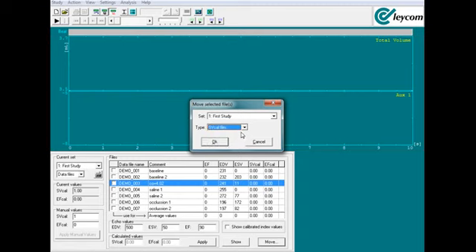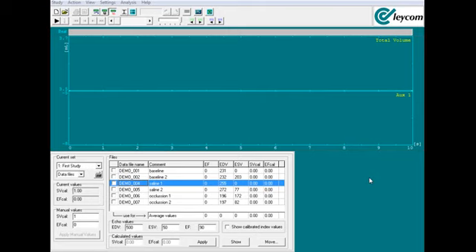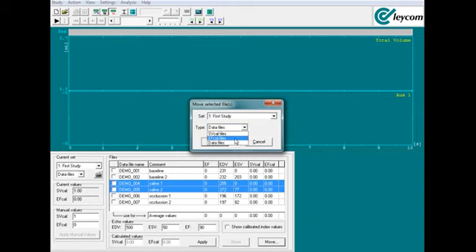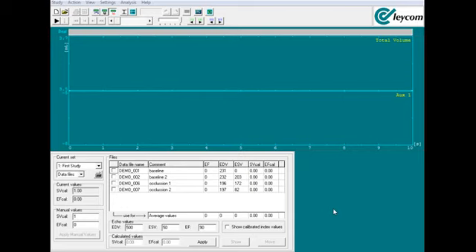One easy way to remember this is cardiac output equals heart rate times stroke volume, thus all cardiac output files should be moved to an SVCal file. Next, we will move our 2 hypertonic saline files to their appropriate destination, which will be an EFCal file. From here, we will need to go into both SVCal and EFCal files to make some final adjustments before we apply the volume calibration. Let's start with our SVCal file.